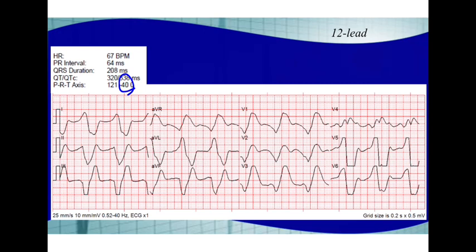And in this case, it's a renal failure patient. And that means they're at very high risk of hyperkalemia. And that's what this 12-lead EKG is showing us. So that straight line that I told you about from the nadir of the S wave to the top of the T wave can cause a pattern known as a sine wave pattern, which we're going to talk about in a second. This patient is severely hyperkalemic. They started losing mentation and eventually deteriorated to an even worse condition.